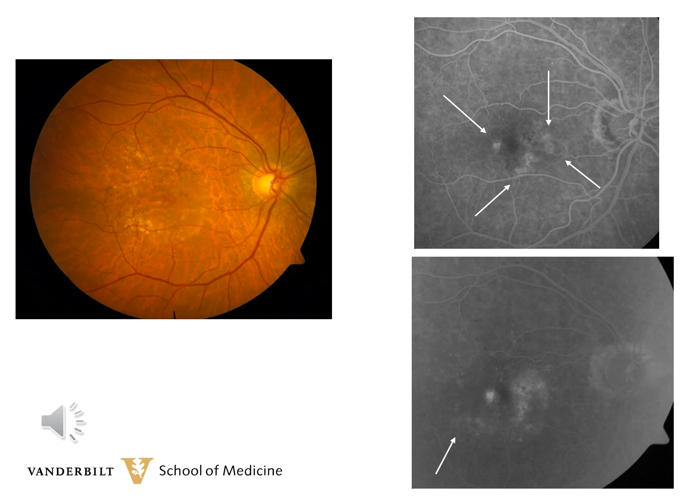Here is another example of a type 1 choroidal neovascular membrane. This is a 76-year-old gentleman with 3 weeks of distortion in the right eye. His vision was 20/150. 6 months previously, his vision was 20/60 due to dry macular changes. The arrows on the early angiogram superiorly point to diffuse hyperfluorescence. You can note there are multiple areas and not one single spot.